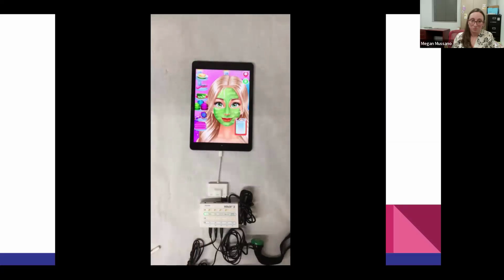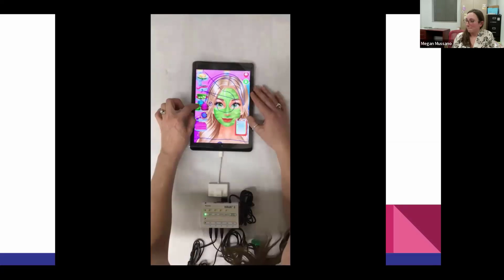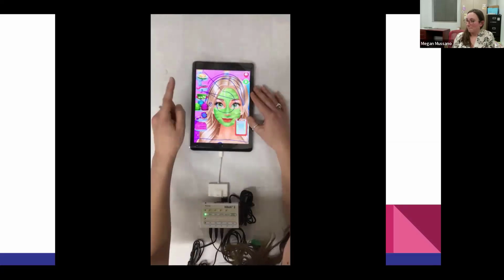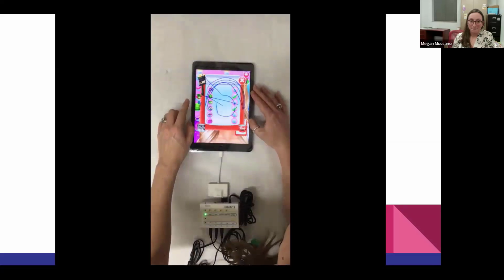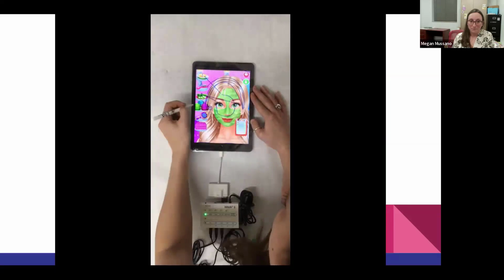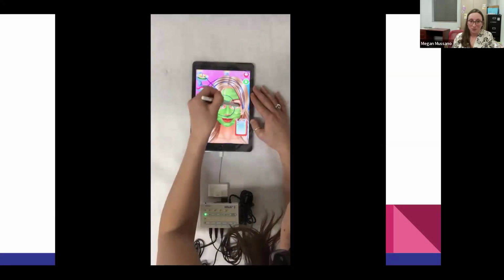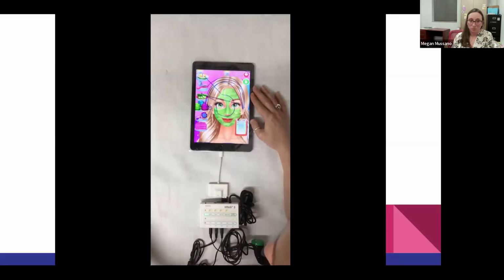You then need to take either some overhead projector film or some laminate. I'm personally using the leftover laminate. You need to practice and look and decide where your finger starts. You can use it with the laminate on, which is very nice. And you need to actually make the marks to say, make sure I go here, start here, and draw the path of what it takes for the app to be successful. This is very important when we're creating custom gestures.